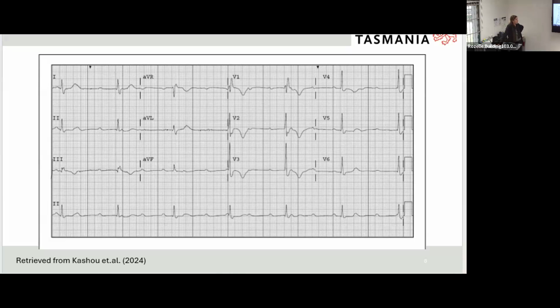So then that would be a T wave because you do have to have ventricular repolarization, and that's what you'll see overwhelmingly on the ECG. So that has to be a T wave, but potentially your P wave would be hidden by that, or might change the amplitude of the T wave in that particular one. Does that make sense, Tal? Yeah, it does. It doesn't help detecting it, but it does make sense.